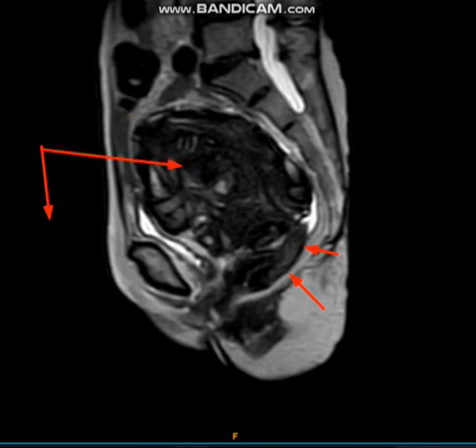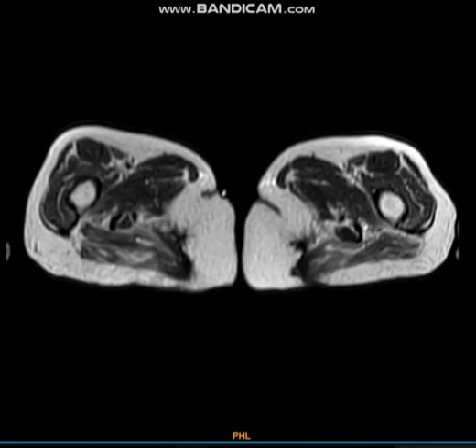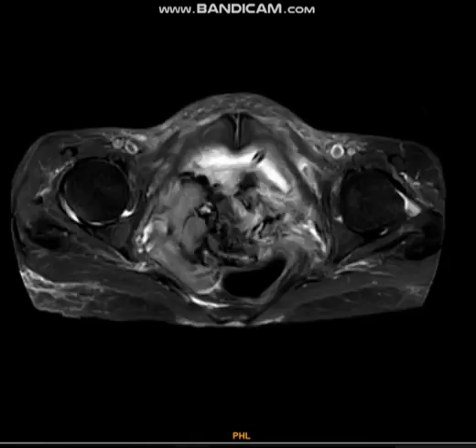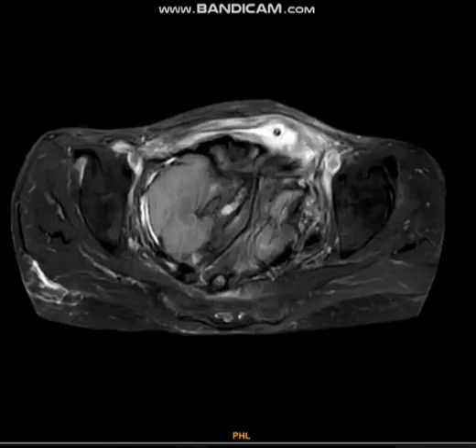And this is a fetal calcified mass that is seen in the abdomen. And we go to look at the axial sections. On the axial sections, we can clearly make out the uterine wall which is going around the fetus. This is the uterine wall, and if you remember on the CT image, we found there is calcification in that wall. So this is the uterine wall, and then the fetal skull vault.